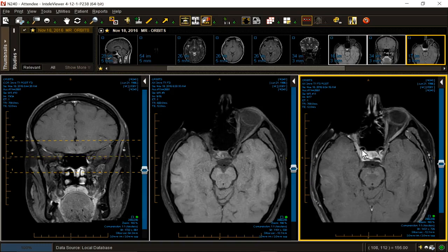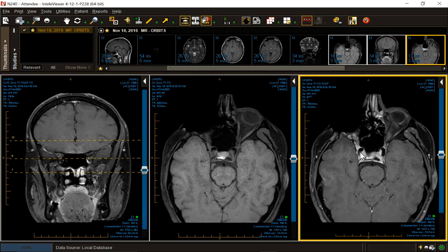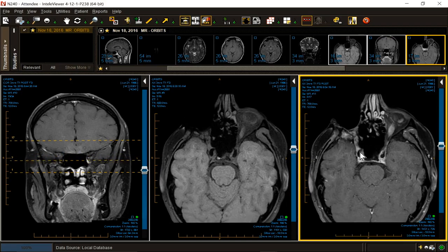We're going to show you some examples of high to low infiltration through the foramen ovale. So now I'm going to tell you that the patient's tumor came from the lacrimal gland. So all you registrars now know adenocystic carcinoma. Number one malignancy from the lacrimal gland, it's adenocystic carcinoma. And it's involving the skeletal lateral wall of the orbit.